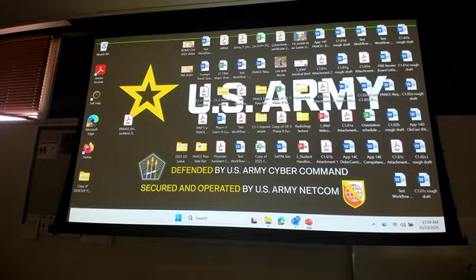Does it say it? Is it the prostate removal? Seeds within a prostate. Yeah, it's a prostate. So radiotherapy seeds within a prostate. That's what I thought that was. It's like little radiation pellets they put in there for prostate cancer. That's what that is on slide 118. It's kind of those little radio-opaque areas. So it's a prostate cancer treatment. I can't remember if it was just the cancer treatment or they actually took out the prostate. Those were surgical clips. So those are like little radioactive implants. Just the radioactive implant, yeah, just little implants to help take care of prostate cancer.